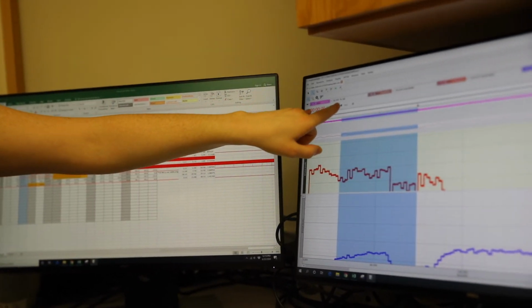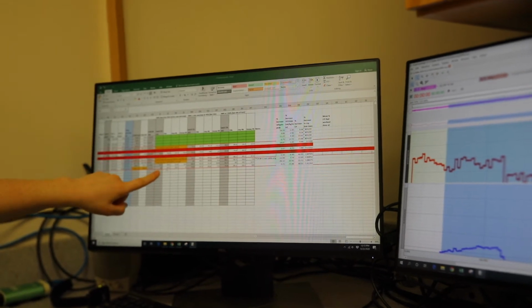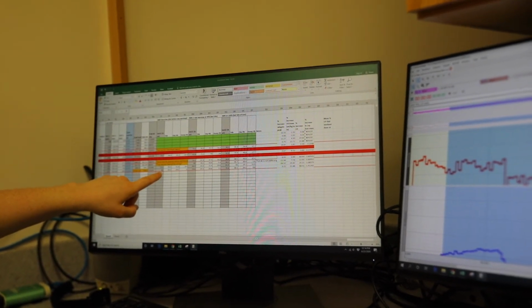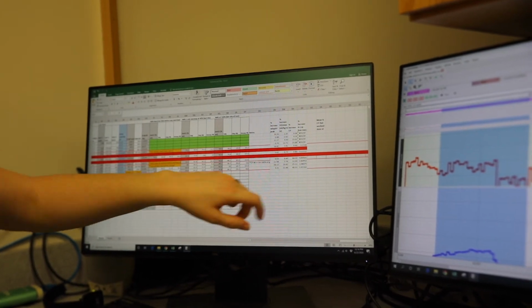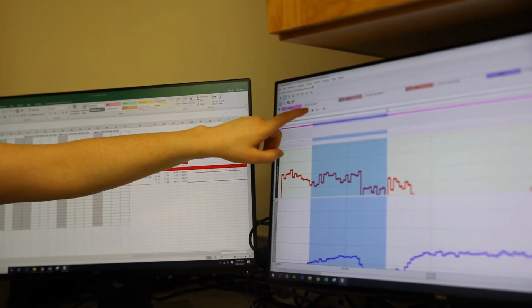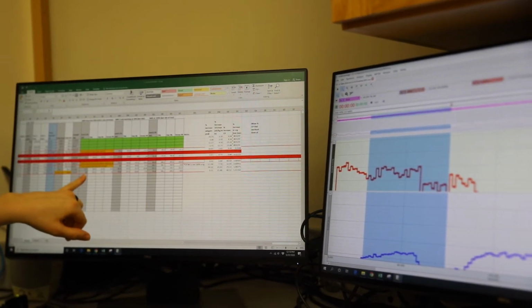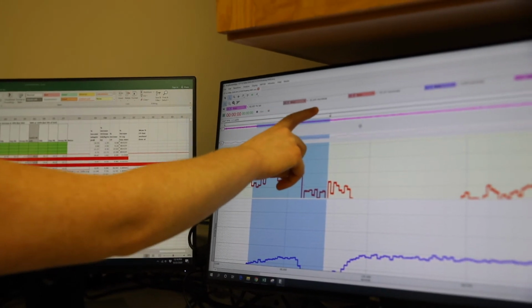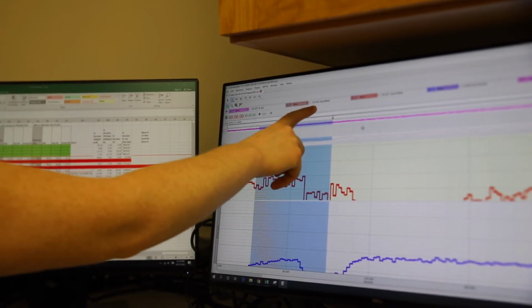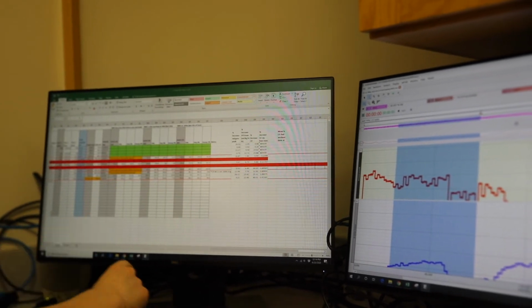So for this first one, it was that percent saturation. So over here in the Excel sheet for this subject, we wrote down 83 because we're going to round to the nearest tenth. Since this rounds up to 83, that's what gets recorded there. And then for the next one, for the total hemoglobin, it's at 35.2, so that's what gets recorded in the Excel sheet.